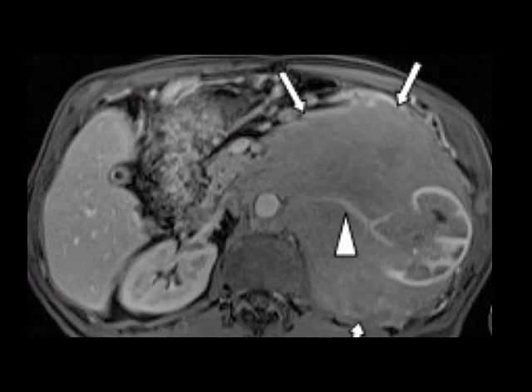This here is pattern 3. Pattern 3 is contiguous extension of lymphoma into the kidney from retroperitoneal disease. This is quite common, and the main findings to help you spot this as lymphoma are as follows. First of all, you have this big, bulky retroperitoneal mass that will envelope the renal vasculature and then invade the renal hilum, which you can see on this picture.